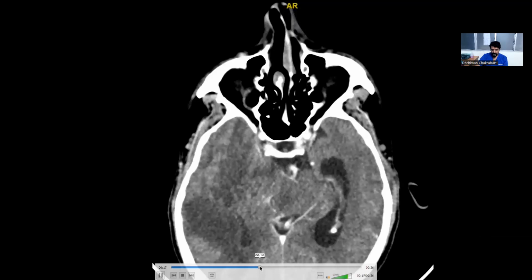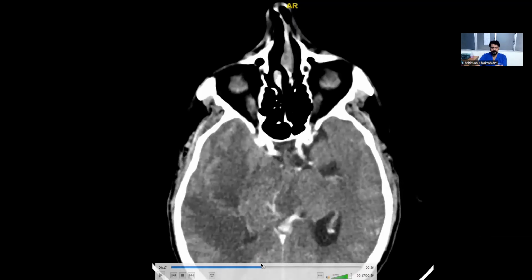After the clivus has come, you go one step above the clivus. As soon as you go one step above the clivus, you will classically see the midbrain and the temporal lobe, and you should be able to see the cistern around it. Here you are not able to see anything like that. You are able to make out the shape of the temporal lobe, and by that you know that this is the brainstem. And you are able to see the temporal lobe outline here separately.